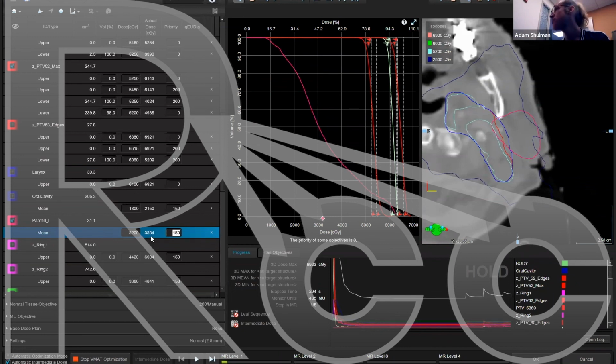So it's probably been pushed enough. So I'll go ahead and go to the next step. And then at the next step, I'll repeat this. Once it's about 1.5 gray away, it means it's probably been pushed enough. Then we'll go to the next step further on in the process.